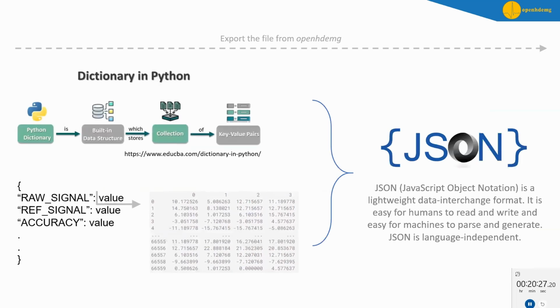Having a common structure of the data is particularly important because in this way all the functions can operate well on your data. But it's also extremely important when you want to save your data, because you can process them, but you also want to store them for future use, or simply you want to keep working on another software or on another programming language.